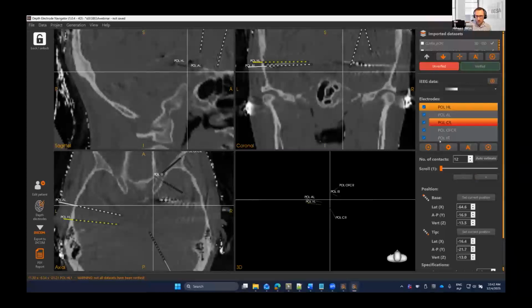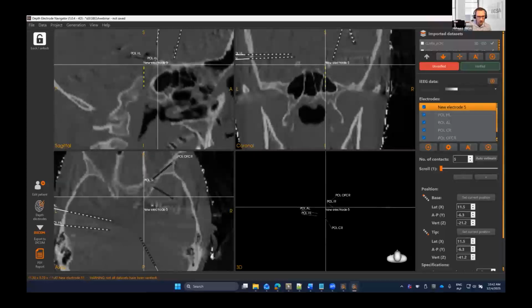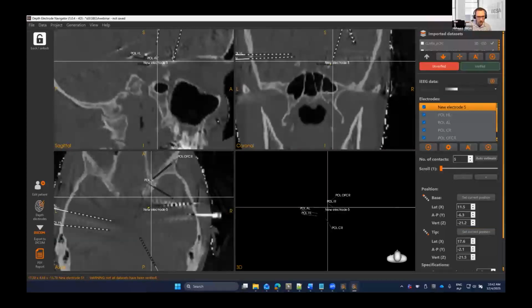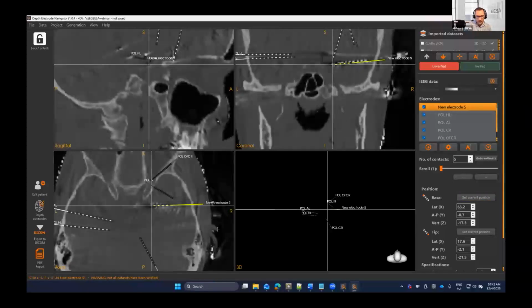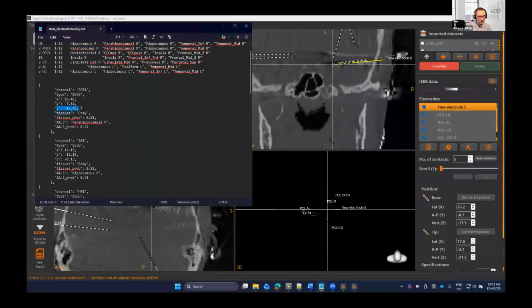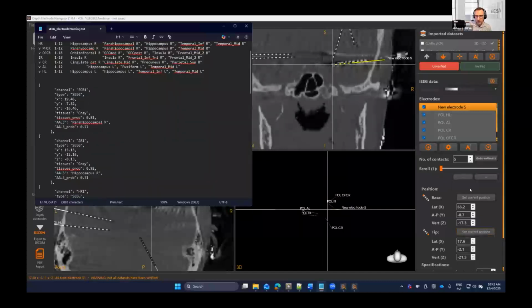We have the pin, I will just add the electrode and go here, and we have the electrode pin tip, and then we go a bit up from here to track the final part of the electrode. The lowest one, we look at the Z coordinate here. Yeah, this is the ECR.